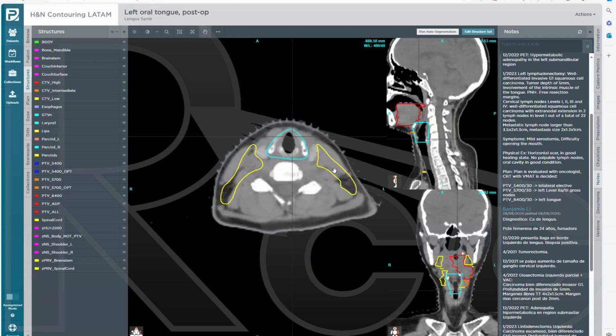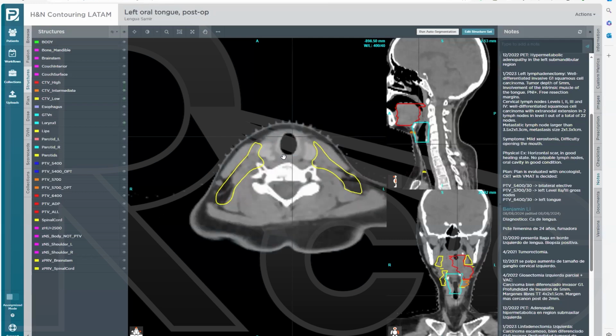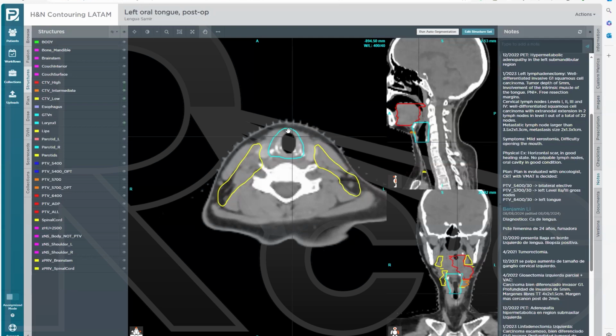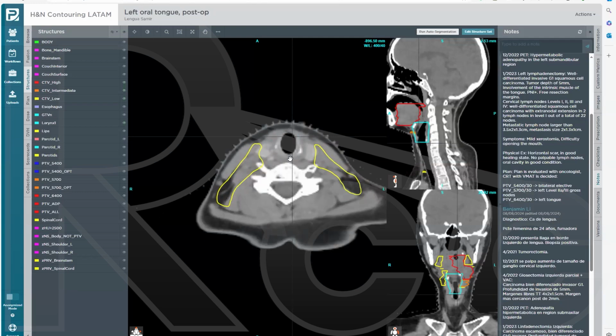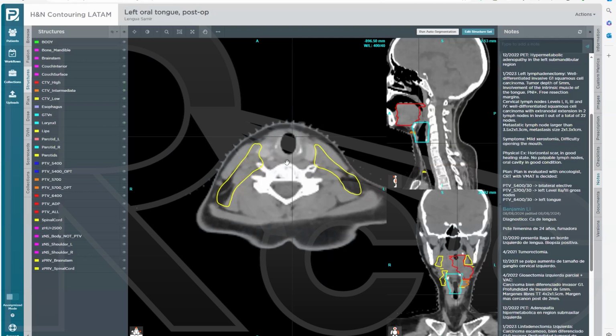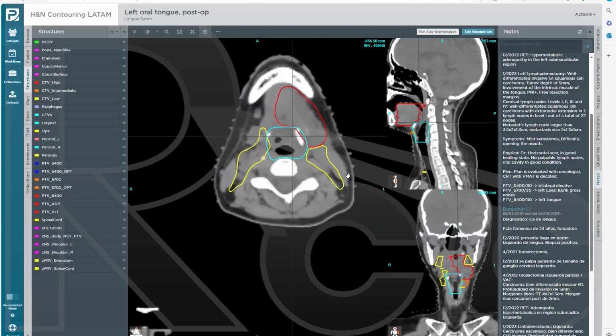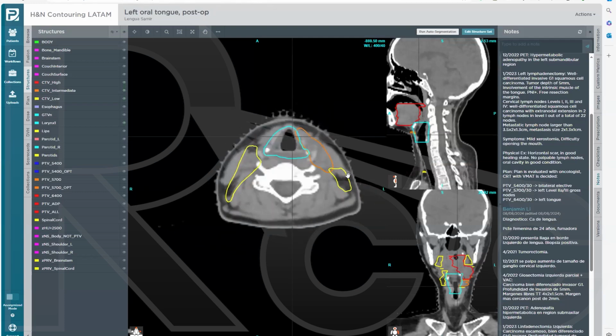And also, when you're drawing level 3, that orange volume, we should go all the way down to the bottom of the cricoid, right? We wanted to cover levels 2 and 3. Bottom of the cricoid, right? This is the cricoid cartilage. Dr. Patel, we have a question. Do you always include the sternocleidomastoid muscle after surgery or only when you have extranodal extension?